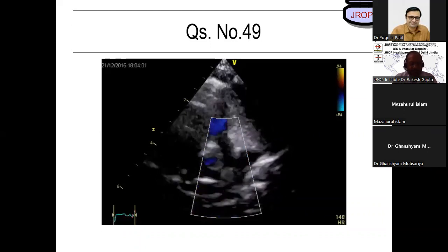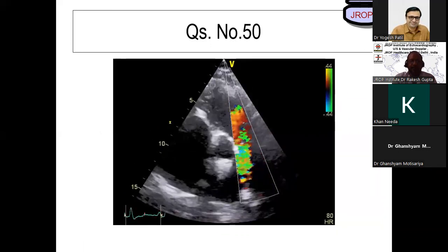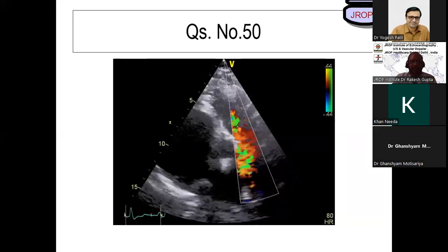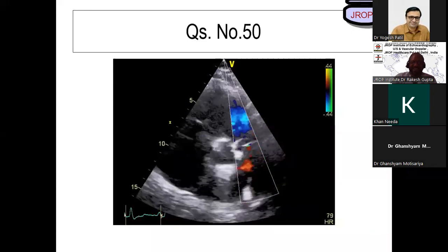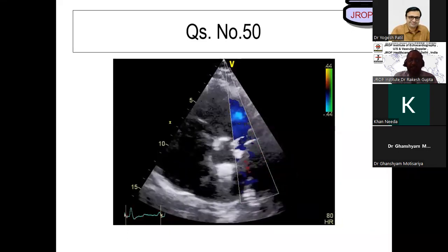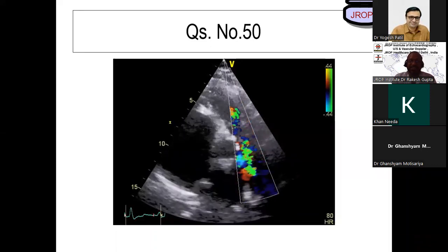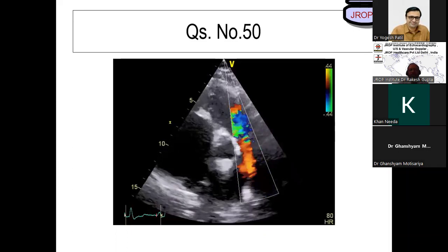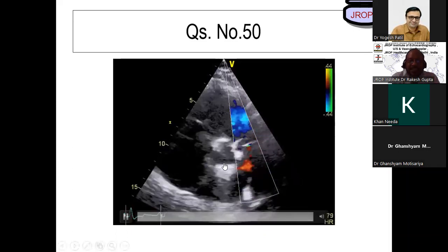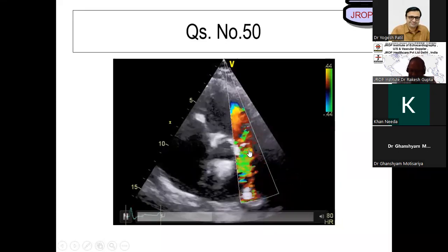All right, Majroon. Next question is for Nida. Nida, ready? Yes, sir. Tell me what this picture is, Nida. Pulmonic valves, pulmonary stenosis at valvular level. No. Look carefully. One minute, sir. Supravalvular level hai. Perfect. You got supravalvular pulmonic stenosis. You've previously got pulmonic stenosis. Now supravalvular pulmonic stenosis. Membrane is there, yes, sir. Great. Good pickup, Nida.